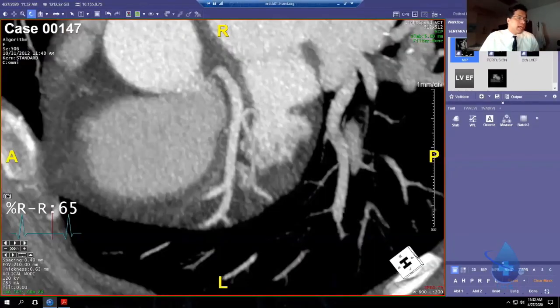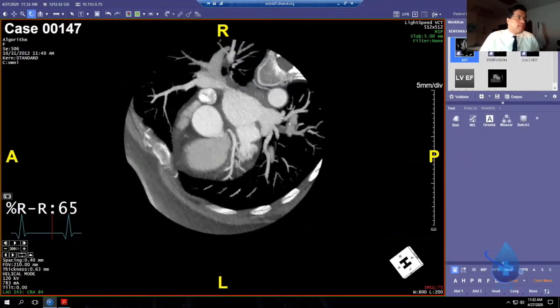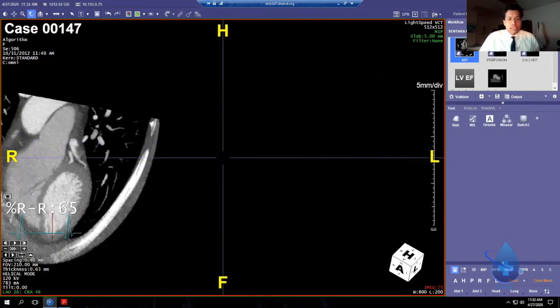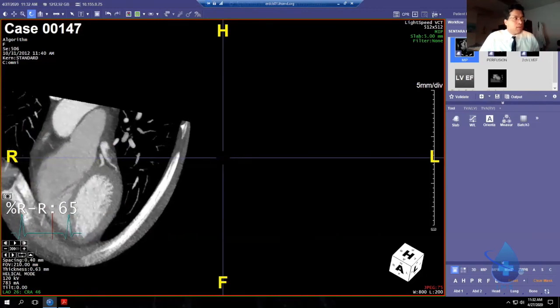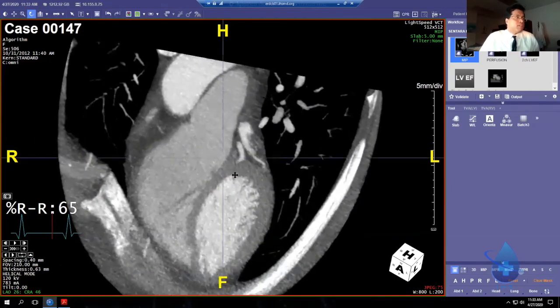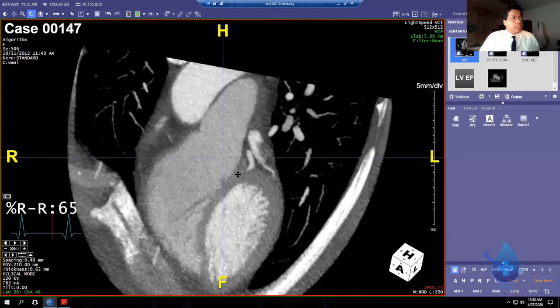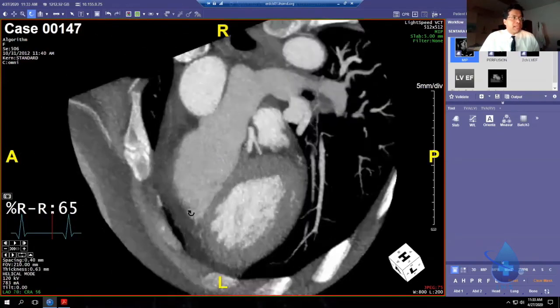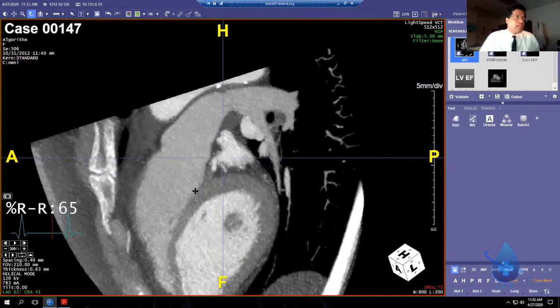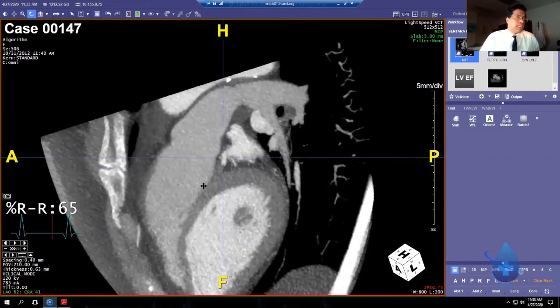The workstation, TeraRecon, has a target. When I right-click on the screen, it brings up a target. Why is that in the workstation? Well, it's a panning function, but whatever cube is in the center of that target, that is where the center of all subsequent rotations will be made around, okay? So it essentially locks on whatever you are looking at that moment.